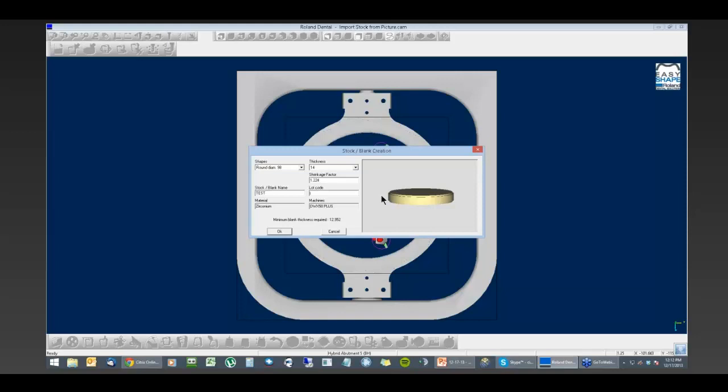So if for some reason you got a call from your zirconia disk manufacturer saying, hey, this lot was bad, we need to recall those products, it's a good thing to have this lot code. You can print it out on your run reports and use it for traceability if you need to go back in the instance that there's something wrong with that material. We're going to leave that blank for this presentation though.